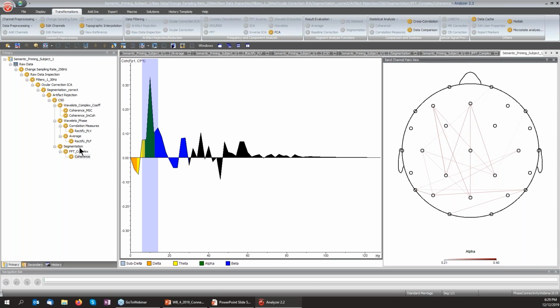Okay, so the steps for a coherence analysis based on the FFT is first take out the data that is quasi-stationary, then apply the fast Fourier transform, choosing the complex output with only the voltage option, and then you can apply the coherence transformation.